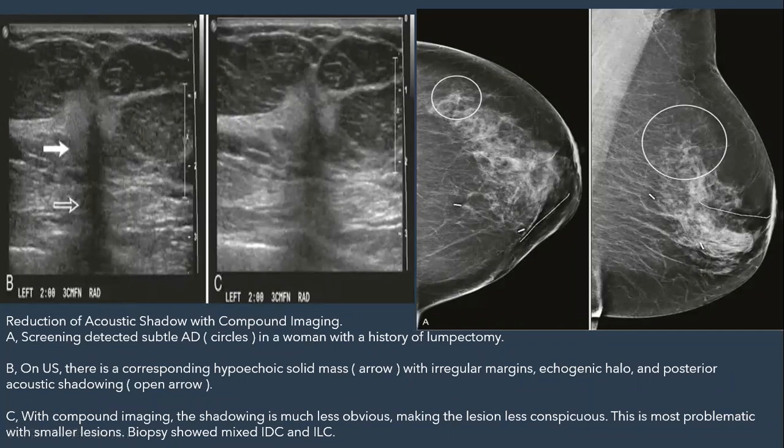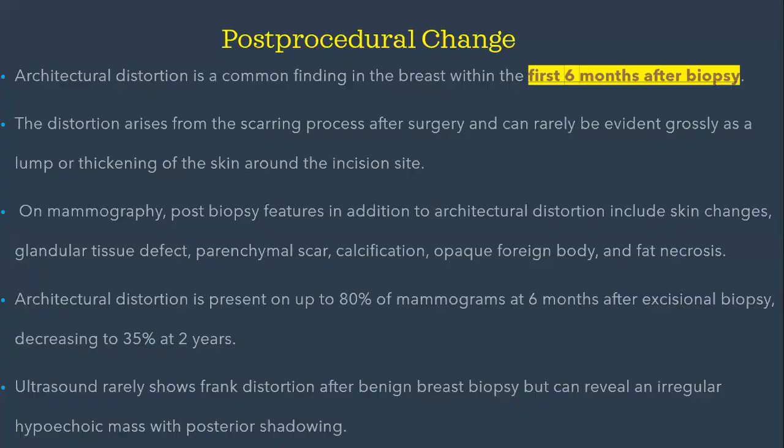Yes. And biopsy of this case revealed mixed invasive ductal and lobular cancer. Okay. Post-procedure changes can be seen within the first 6 months after biopsy, such as distortions and skin thickening.